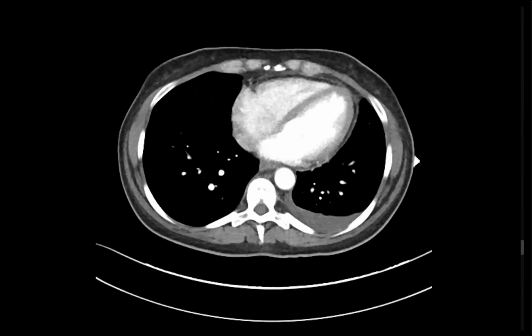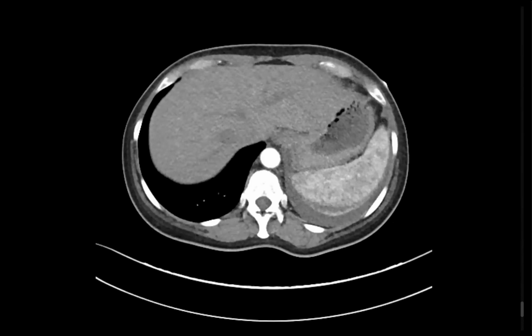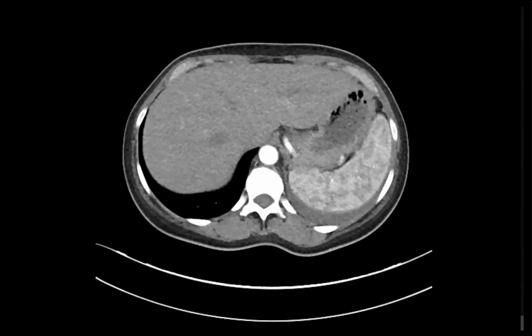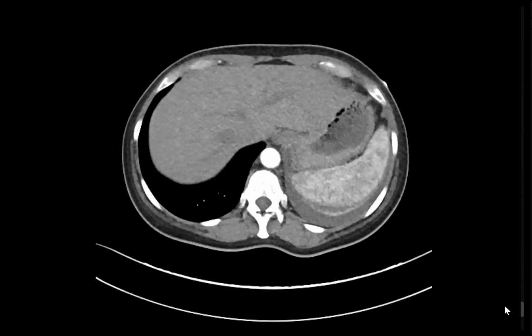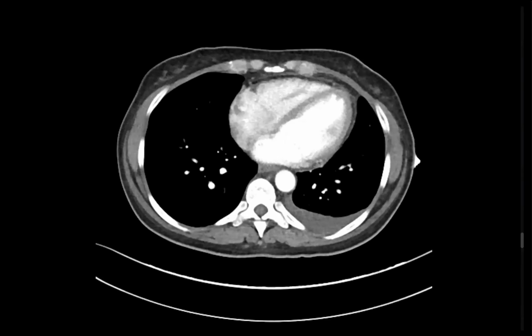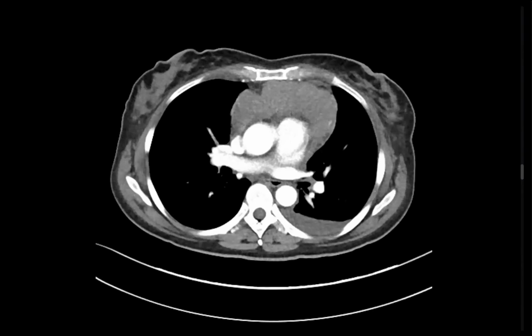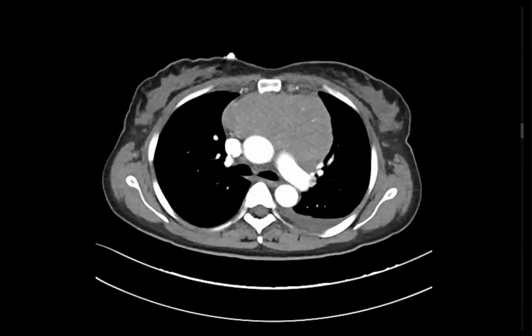Good. I'm reaching the upper abdominal cuts to search for lymph node enlargement, splenomegaly, hepatic focal lesions or adrenal lesions, and comment on all this. And also any pericardial thickening, any pleural nodularity, comment on all this. Okay, continue.